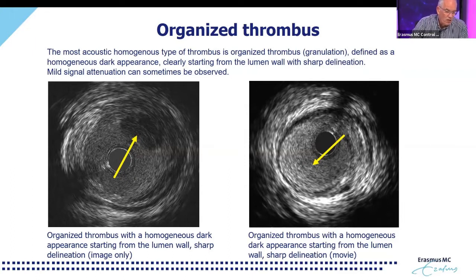Well, we wrote a book chapter about that, for the people who want that, where it is explained in more detail. But those are the three parts: acute, subacute, and organized, that we're going to recognize.